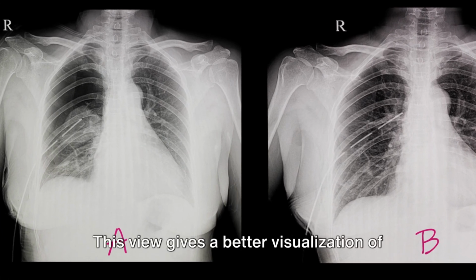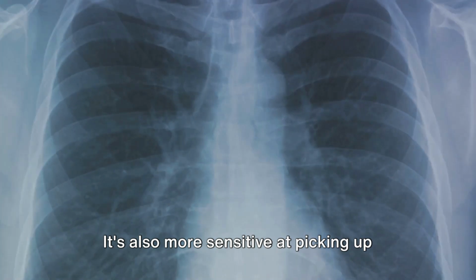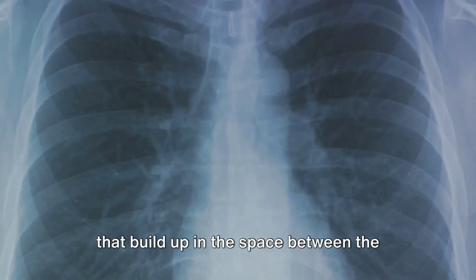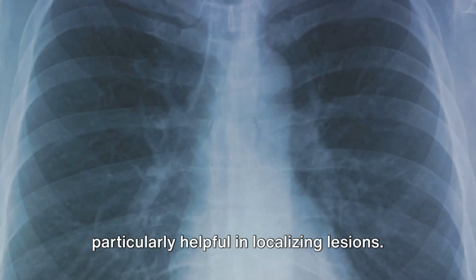This view gives a better visualization of the retrocardiac space and the thoracic spine. It's also more sensitive at picking up pleural effusions, which are excess fluids that build up in the space between the lungs and the chest wall. When combined with the PA view, it's particularly helpful in localizing lesions.